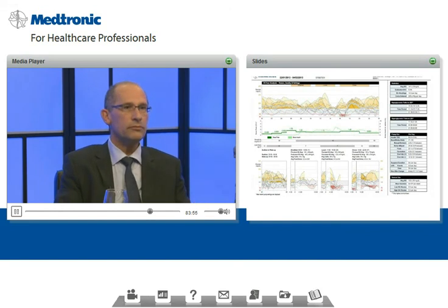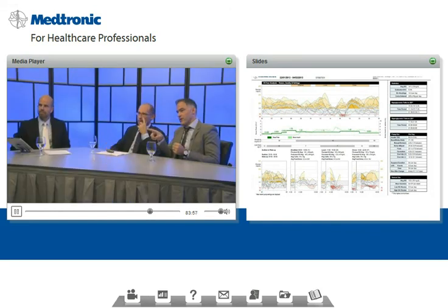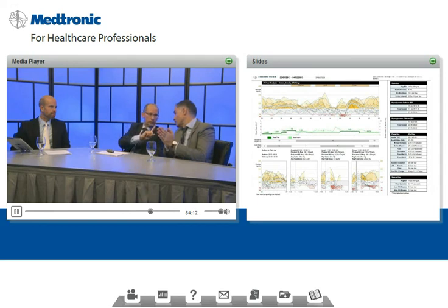Well, you see that in the overlay by meal, but even here that clinches it for the overnight period, where you see that she doesn't have active bolus, let's say, after midnight, that's responsible for drops at that time, not that she really has them. Here, she needs more overnight basal.